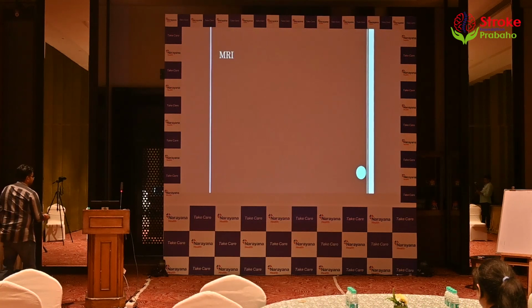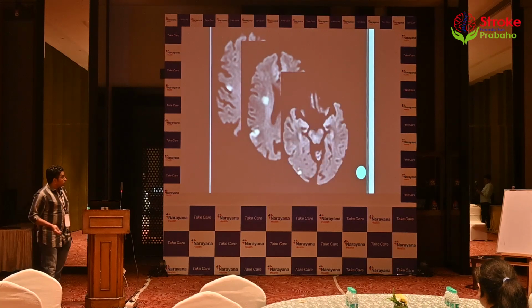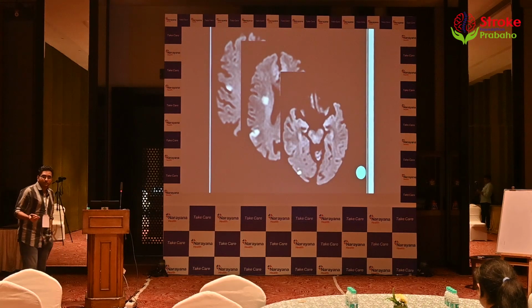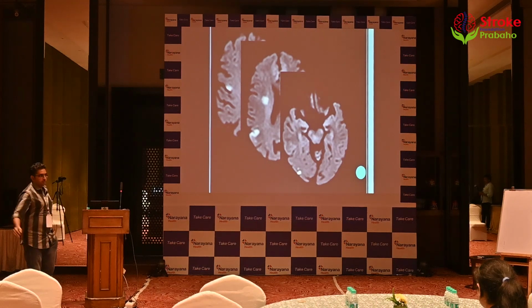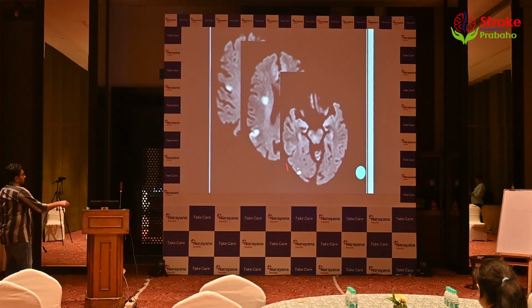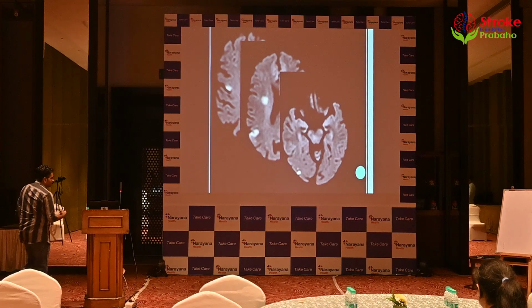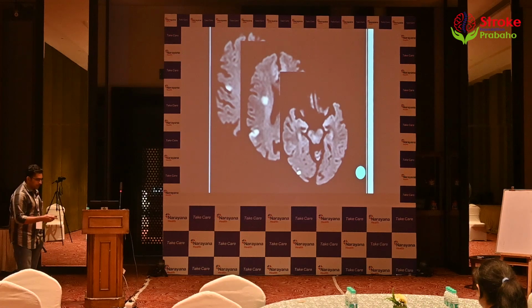Coming with recurrent symptoms. MRI, again, as I told you, I tend to push on the images a lot. So diffusion is probably the first sequence. Everybody does it. What else? Apart from saying, yes, there are multiple dots, the thing that I would like to point out is the watershed involved. The moment you have watershed, then we think, okay, this could be a block somewhere supplying that area. This block could be MCA, could be ICA. It has come with a low NIHSS stroke.